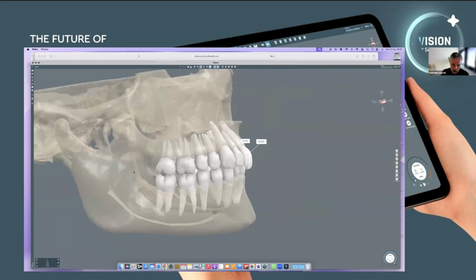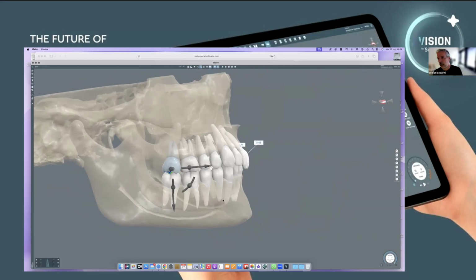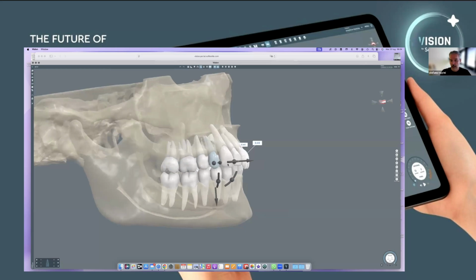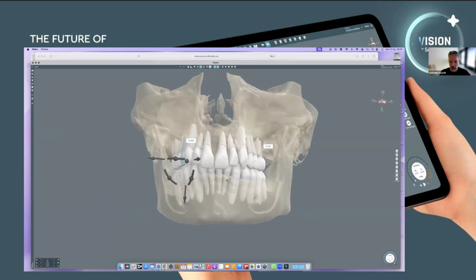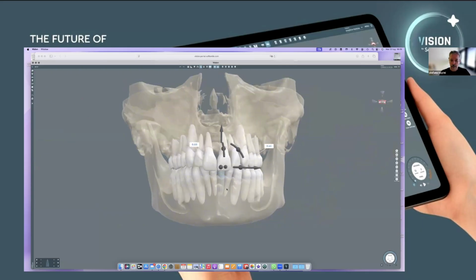And I also put this one distal, but when the case is on just one side, I like to work with protocol 100%. 100% means 100% movement for the second molar, and after that 100% for the first molar, second premolar and first premolar, and after that try to close the space with the canine and also the incisor. And also I adjust the midline a little bit, keeping the incisor to adjust the midline very well. And that's it.